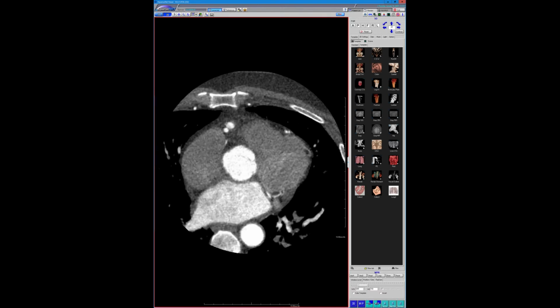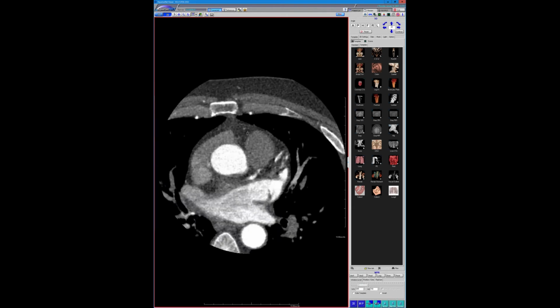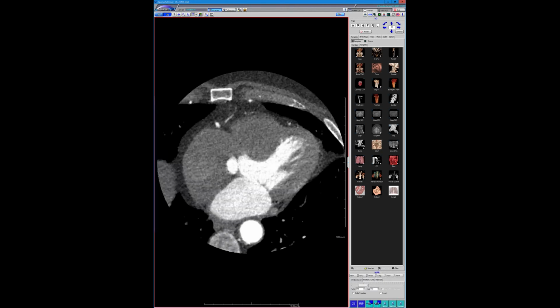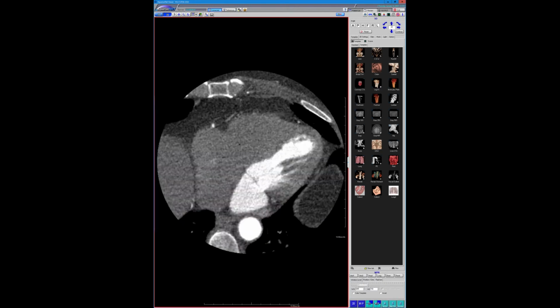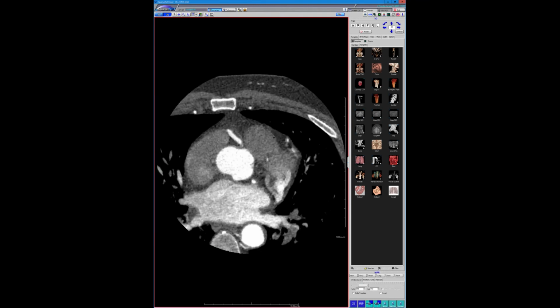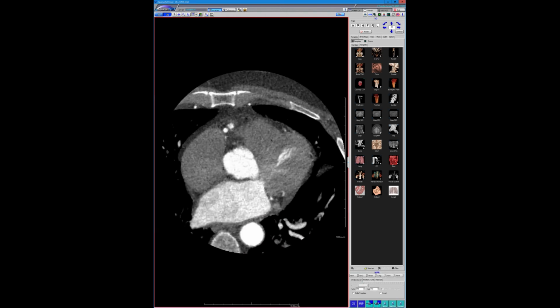Oh, Seth, this is the comparison patient, not your original patient, right? No, this is the comparison patient. So this is one patient. And then this was the patient that we saw. I don't know why this phase got sent over. I must have sent the wrong phase. This is the patient that we saw, the patient with the paragangliomas, that was from like 2 years ago. This is a patient we just saw a couple weeks ago, and still not really sure what it is. They don't really care, the cardiologist, he's 78. They don't seem that concerned. We're telling them to get potentially an MR or other.